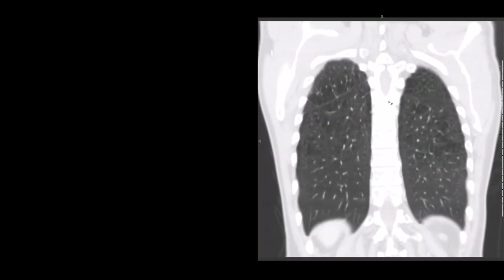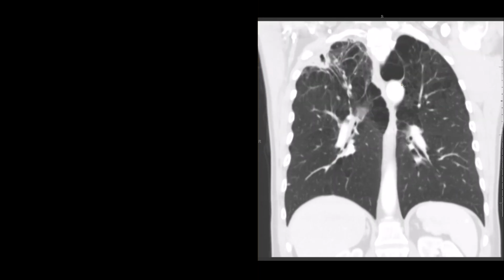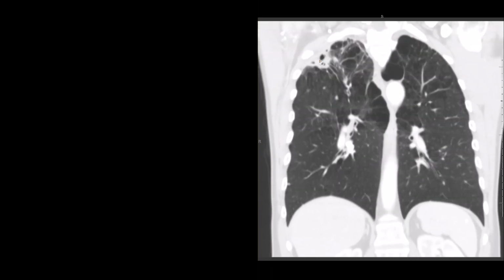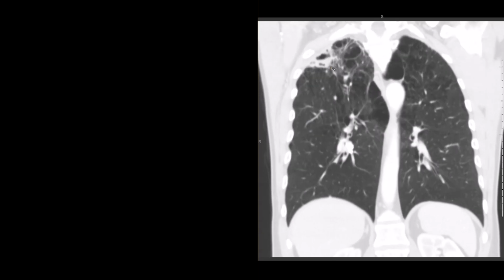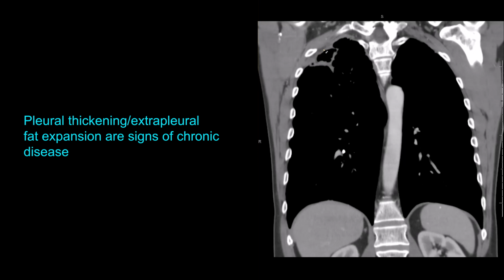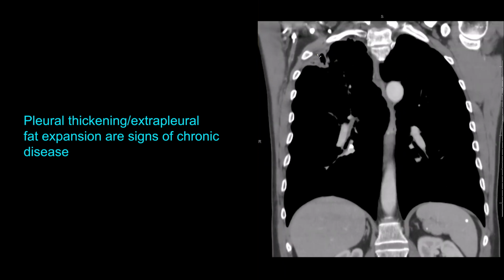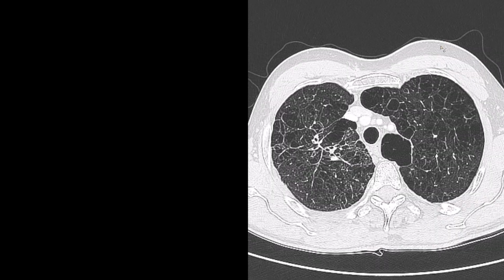So a CT was done for this patient, and on the coronal images, first you can see the emphysema in the upper lungs. There's that big bulla in the medial left upper lung, and here's that cavity in the right apex. And when we go to the soft tissue windows, you can see that there's a little bit of pleural thickening, and it's pulling in the extrapleural fat right there. Here's what it looks like on the axials.